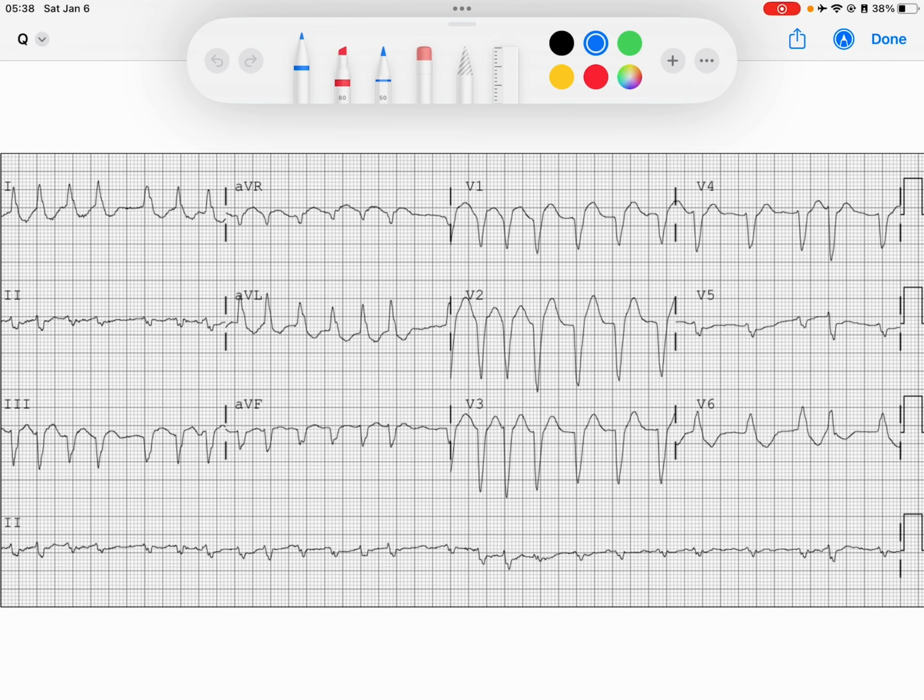So here I've got a good EKG. I'm going to go ahead and what I call take a look at the forest, and my forest are the trees, and so I like to start off with my lead 2 rhythm strip and just get an idea of what's going on with this rhythm. If you notice, I've got these little QRSs in lead 2 that are occurring quite rapidly, and as I make tick marks, they're occurring somewhat irregularly. Some of them are longer duration, some shorter, some intermediate, and so there isn't a particular pattern to this rhythm.